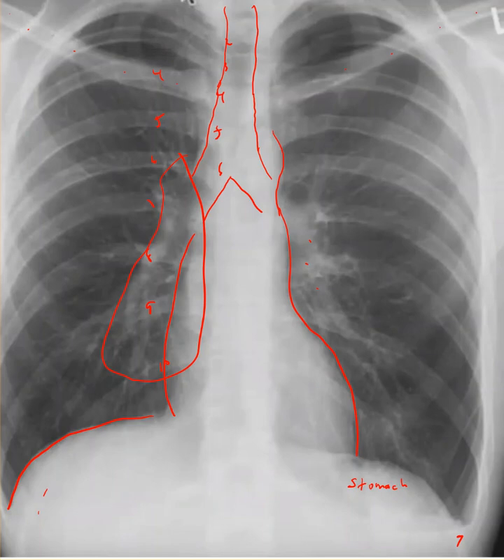You can see pulmonary markings, vascular markings up in here. You'd really be able to see it if you could magnify it like you can at the hospital. But here you don't really see any pulmonary vascular markings. And same thing with here. Look at the difference between all the markings you see here, and you don't really see anything here.